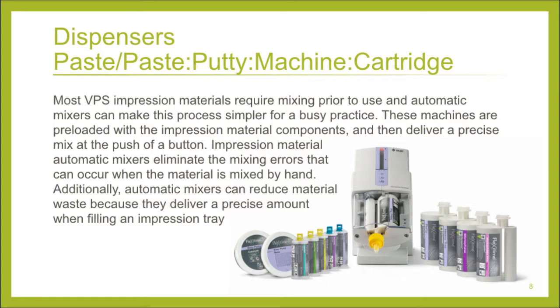If you're going to take a lot of impressions and you know that you're doing that already in your practice, the best way to cut down on the price and the product that we're using and to be able to take more impressions is to maybe switch from our conventional gun to our bigger machines that will hold these cartridges, which allow us to take a lot more impressions than we would if we were using the cartridge or using the putty in a tub.